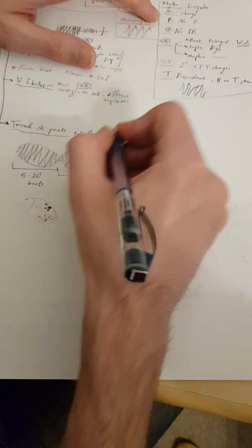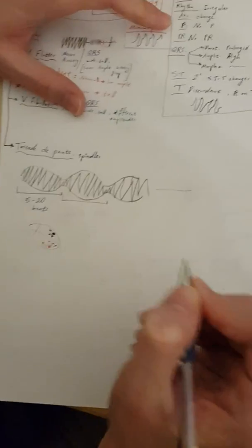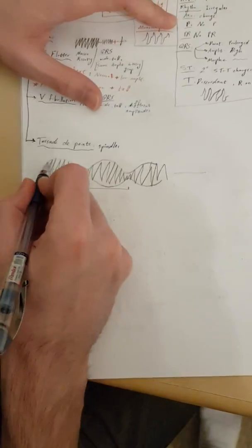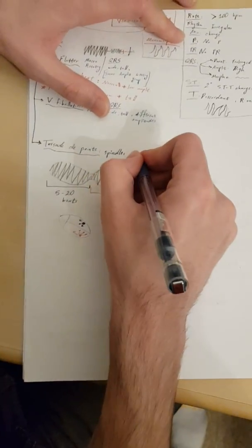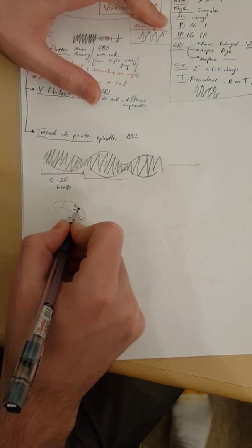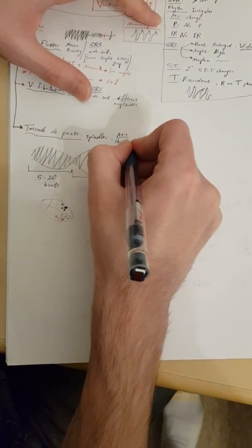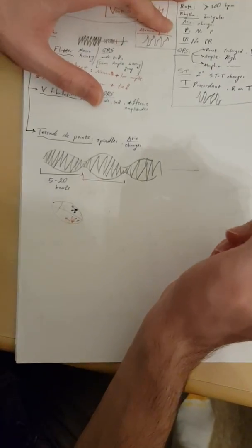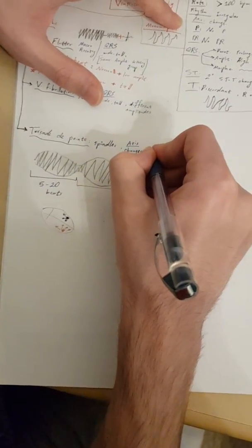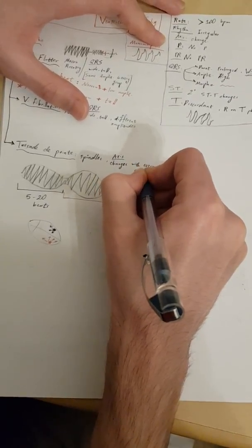Okay? So what happens here? What do we say? There are spindles. This is the amplitude. So it's spindle shaped, or the amplitude goes like this. And the axis, now we don't know where the axis is, but we know for sure that the points are changing every time it's coming. So we don't know exactly how much the axis is, but we know for sure that it's constantly changing with every spindle.